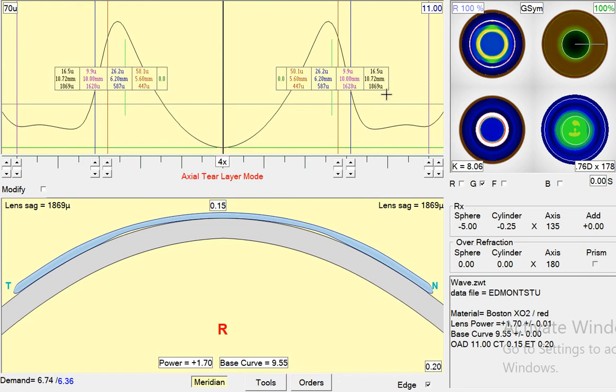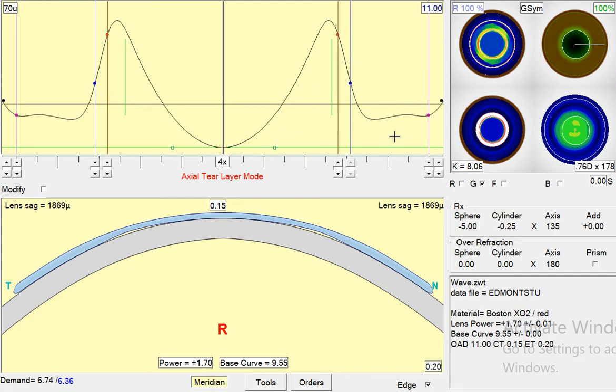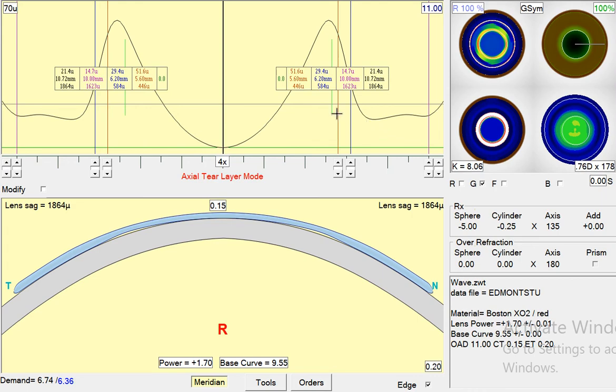And then I'll right click again to see where we are. So we're at 587, maybe one more. Okay, 584, that's our target at the blue, and we wanted 1627 here, so we've lifted a little too much. Come back down.